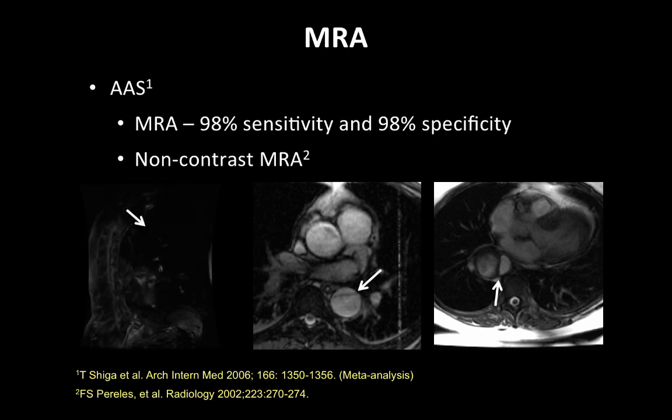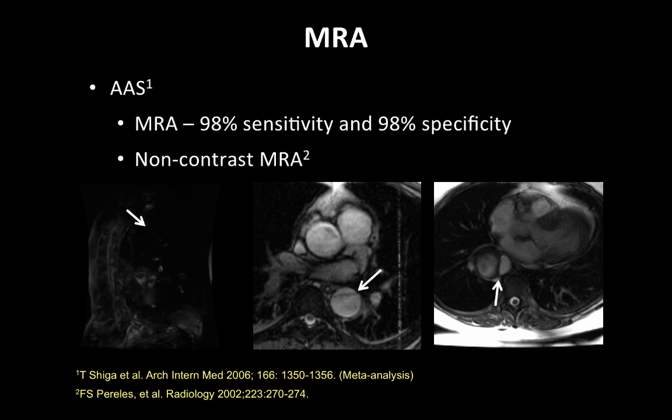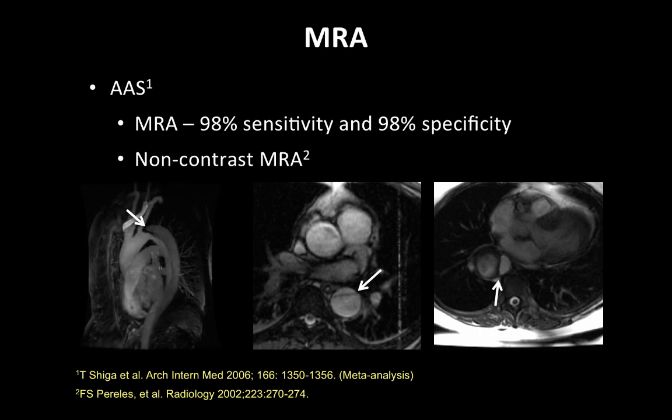And in fact, if you've got patients that cannot get intravenous contrast, either CT contrast or MR contrast, there are very good non-contrast enhanced MRA methods that are very, very quick, including the single-shot steady-state free precession images that you see in the middle and bottom right images.